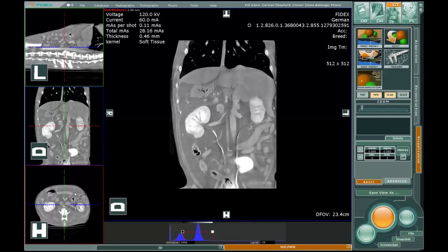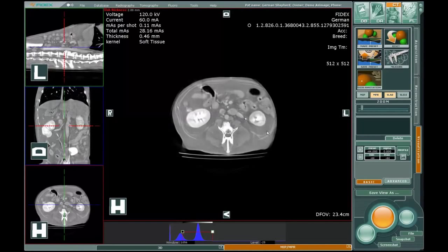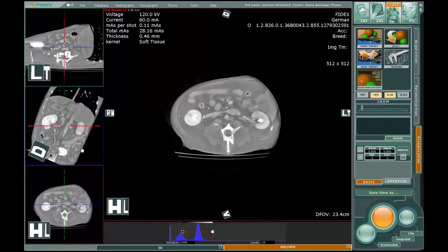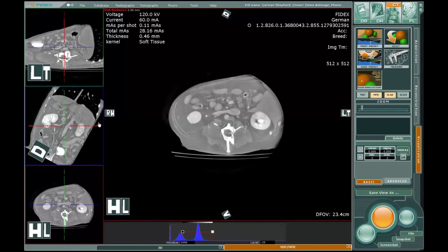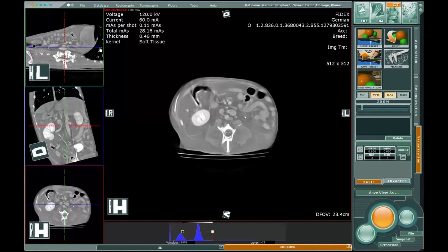The 3 planes are always orthogonal to each other, but do not have to be parallel to the scanner coordinates. It is easy to make oblique cuts using the small window. Grab one of the extensions of the coordinate axis to rotate the image. By repeated rotations, one can make double oblique cuts as well.